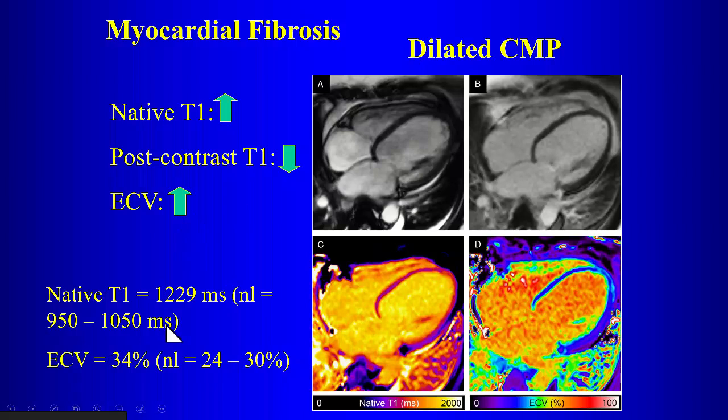Okay, in those cases. And then by the color maps, so if you're doing T1 mapping, you look at the color maps. So this is ECV, and the color gives you an idea of where it falls, but you'll usually just take a direct measurement, a region of interest, and that gives you an actual numerical value. And you can do the same thing with your native T1 times, right? The software will give you an estimate of what the T1 time is globally for all of the myocardium, or you can take it for focal regions.